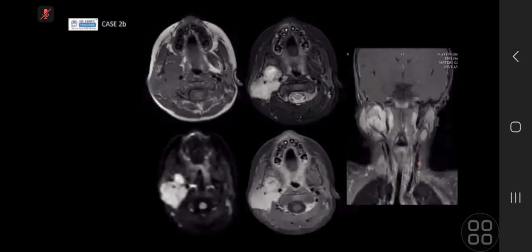In the front here of this region? Sorry, can you see my pointer? Yes, I see this, the base of the tongue. I think there is, in this anterior part, I see there is some high signal thickening of the mucosa, of the pharyngeal mucosa anteriorly.